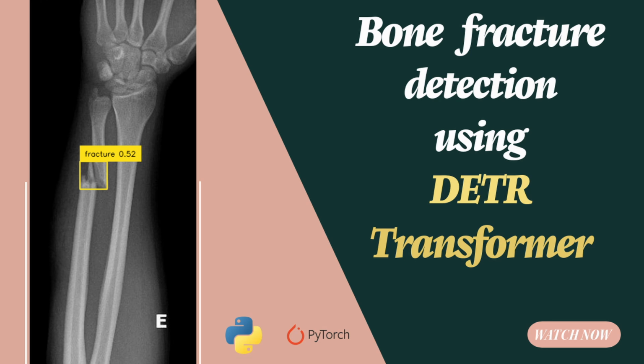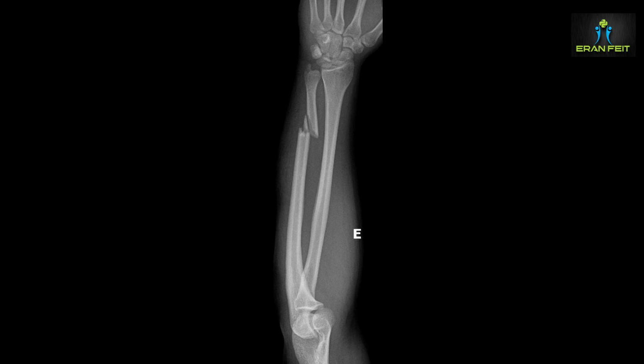Hi, today we will generate a bone fracture detection model. So this will be our test image, and we are going to find and detect the bone fracture in this image. And this model will be based on transformers.